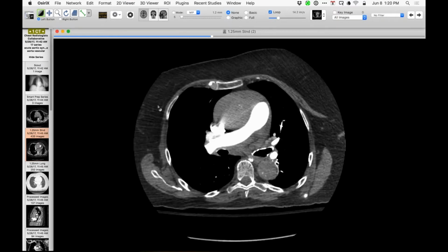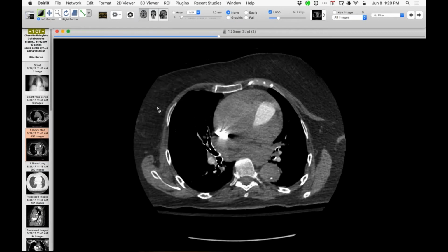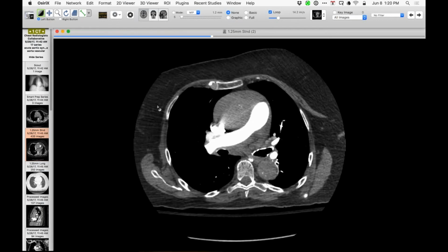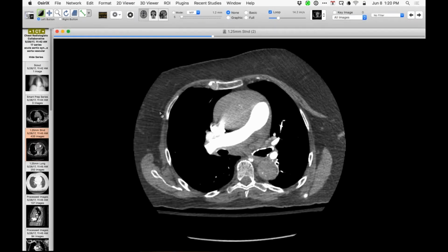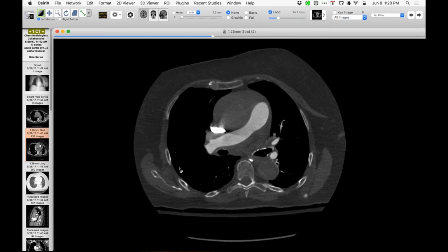Now, I'll scroll through there. I can't quite tell what happened here, why it's flashing like that, whether there's some series that have merged in some way. I can't quite figure that out. But let me just stop there with the contrast medium in the pulmonary artery, and I'll tell you that no acute PE is present, but there is a finding here. I'll just give you a moment to look at that. That turns out to be relevant, which I'll show you a bit more in a moment.